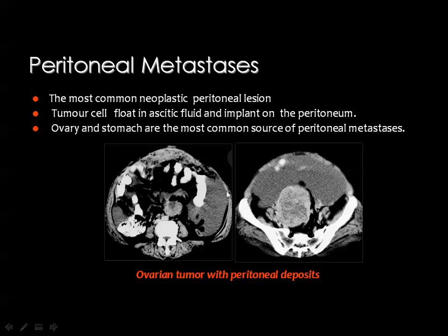The infiltration of the greater omentum will form a mass like this or a sheet underneath the anterior abdominal wall, and through this sheet you can see fat densities, vessels, and soft tissue masses. Frequently you see abdominal ascites, and this is known, of course, as the omental cake.